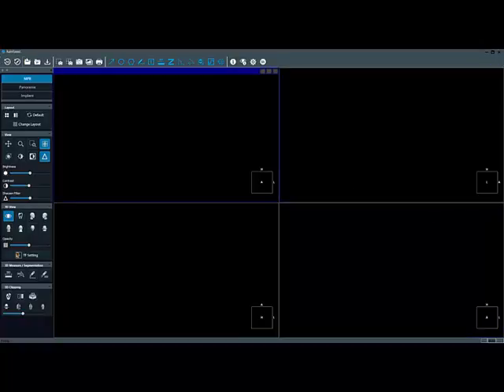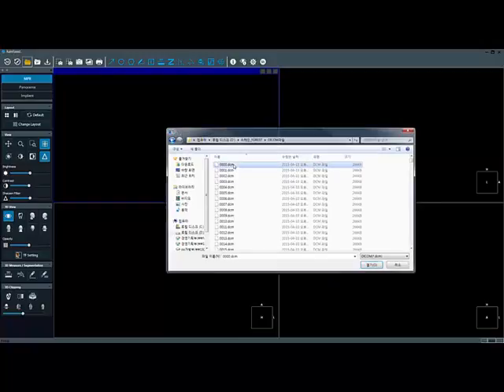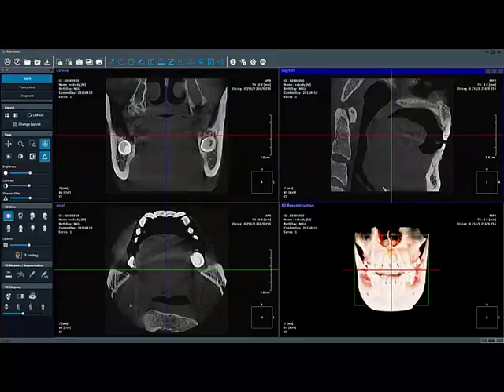Rainforest is a dental diagnosis 3D imaging software that loads CT images based on DICOM format. It is engineered by the precision and experience of experts in the field, and this video is going to show you how CBCT is read in Rainforest.